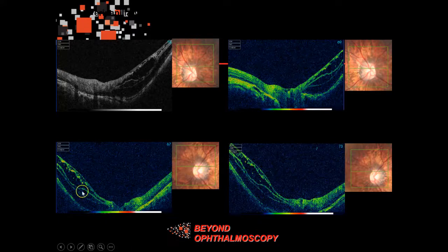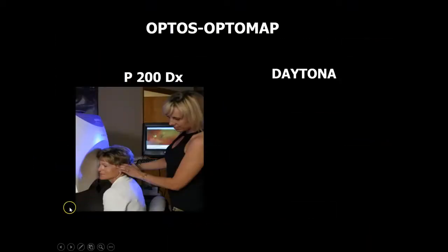Notice that this is now the left eye, and we're getting the nasal cross-sections over here showing us splits. So splits within the retina in high myopes are actually not rare. I think we've seen 25 of these over the last several years. We should really put them all together and document them. We've seen one patient where it goes all the way around, sort of a 200 or 360 degree schisis.